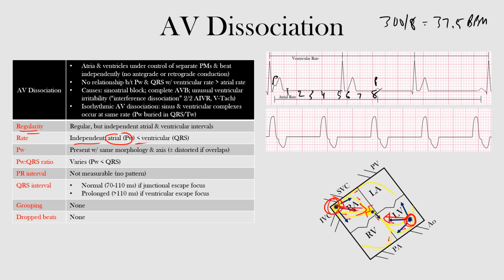And then if we look at the ventricular rate from this R wave to the next, so it'd be 1, 2, 3, 4, 5, okay, almost 6. All right, so if we say 300 over 6, that's about 50, somewhere around 50 beats per minute. And we're seeing here that the ventricular rate, about 50 beats per minute, is greater than our atrial rate, okay? So that's just the main point that I was trying to make.